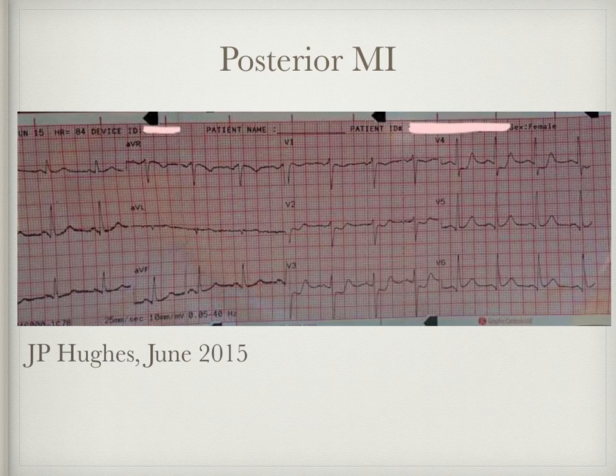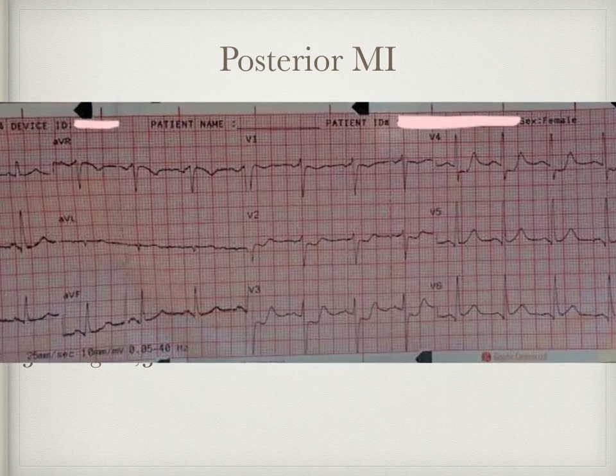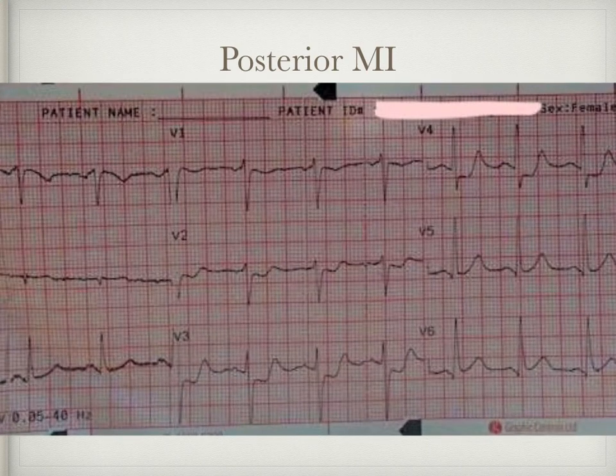And when we look at the ECG, although this doesn't meet the criteria for ST elevation and cath lab activation, we do have some obvious ST depression in leads V1 through to V4. So let's focus on those leads here. The ST depression we see in these leads is horizontal, which is typical of ischemia, and we also see R waves with positive T waves.